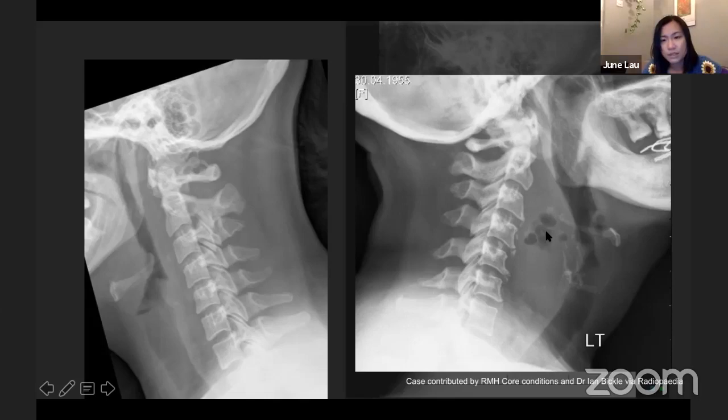What density do you think this is? Compare it to the things around it. What do you think it's similar density to? And once you figure that out, what do you think is going on?